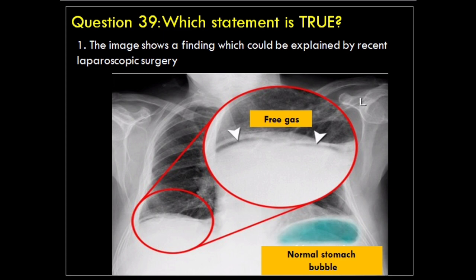When considering imaging with CT, the clinical context must always be considered. It is a higher radiation dose investigation, so should be avoided if not necessary. A systematic approach is always required. The image is diagnostic and so should not be repeated. The heart is not enlarged.